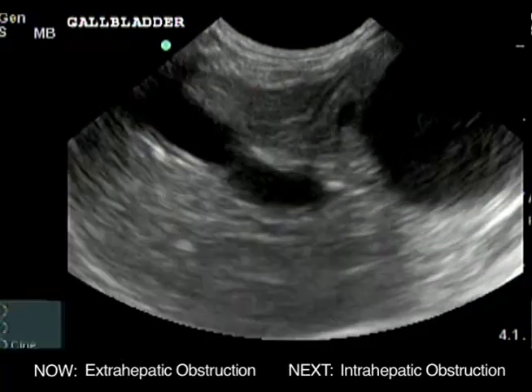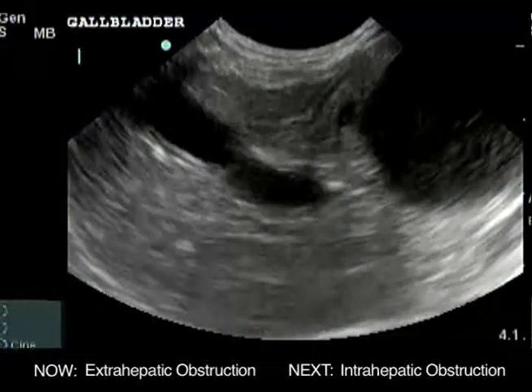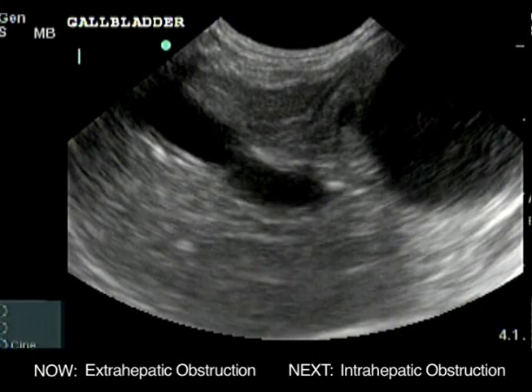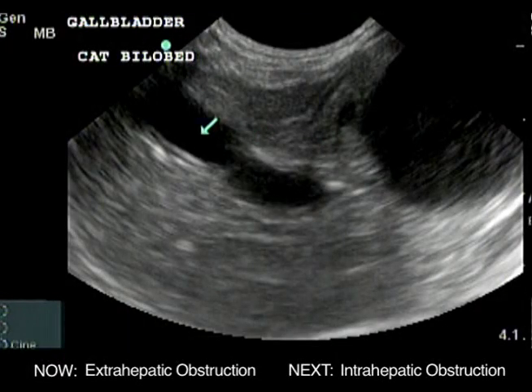Note the double wall of the cranial gallbladder suggesting edema or mild effusion. The large cyst-like structure caudal to the liver is a bile cyst in the main body and left limb of the pancreas. Strong pressure of gallbladder contraction has caused a bile leakage into the pancreas.